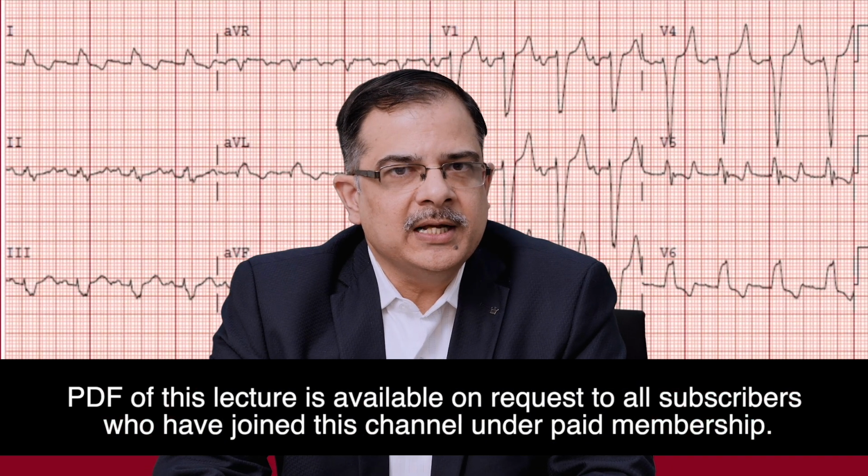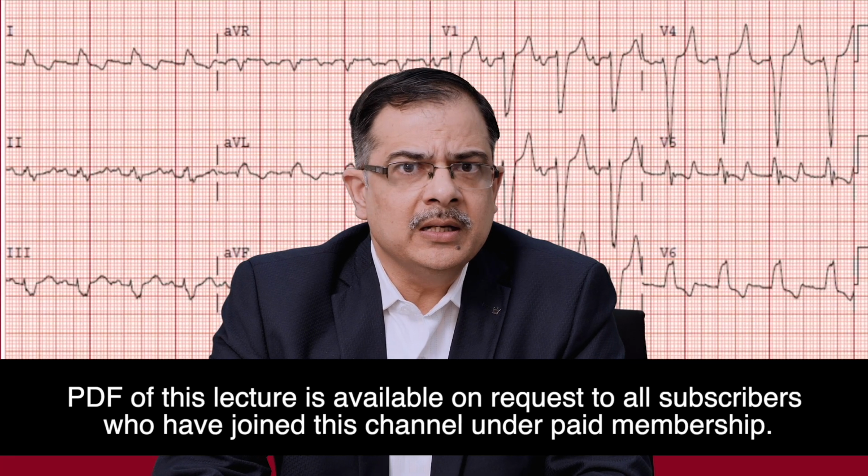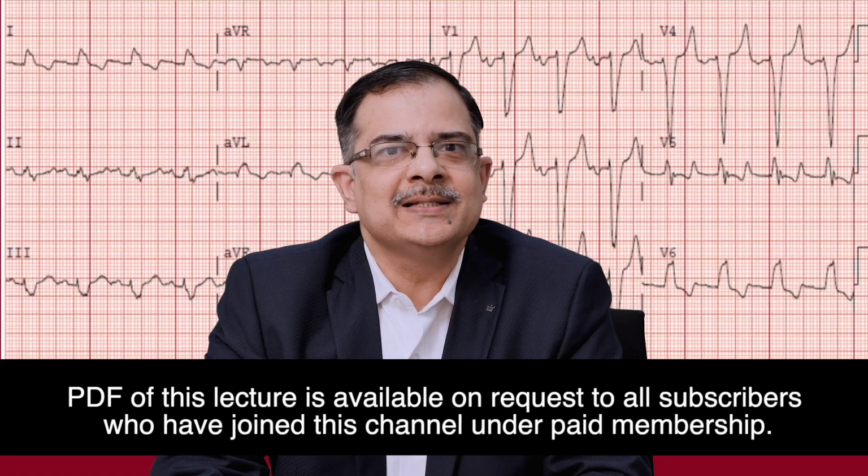So these were the clinical cases and their analysis in terms of ECG, covering the P wave and QRS complex.